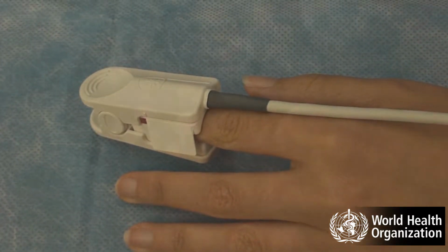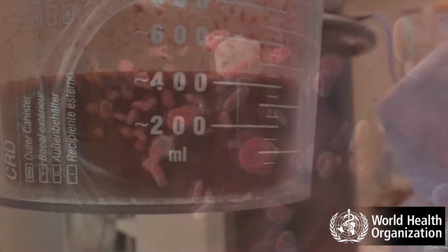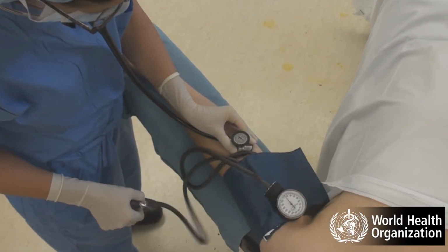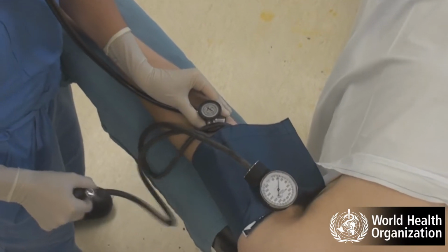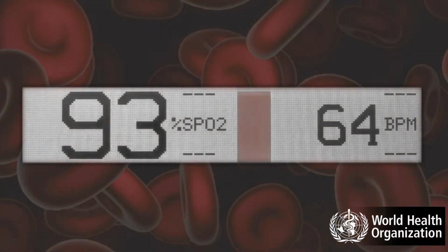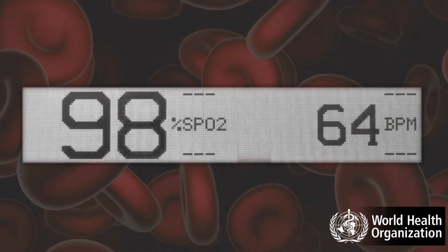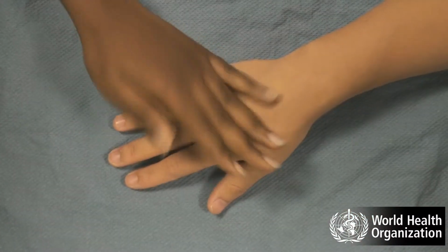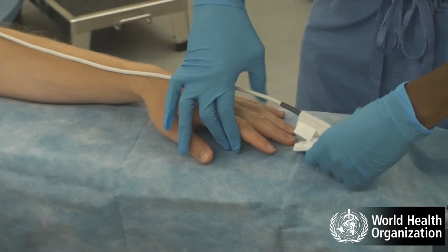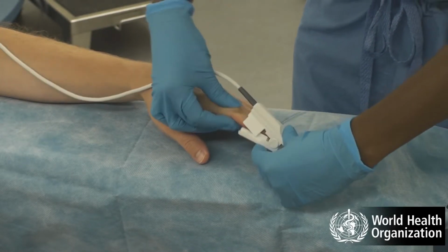Does the patient have poor blood flow? Check for low blood flow, especially due to blood loss, heart problems, or shock due to infection. If low blood pressure is present, resuscitation of the patient is required immediately. The signal will improve when the clinical condition of the patient improves. Check the temperature of the patient. If the probe placement site is cold, gently rubbing the site may restore a signal.